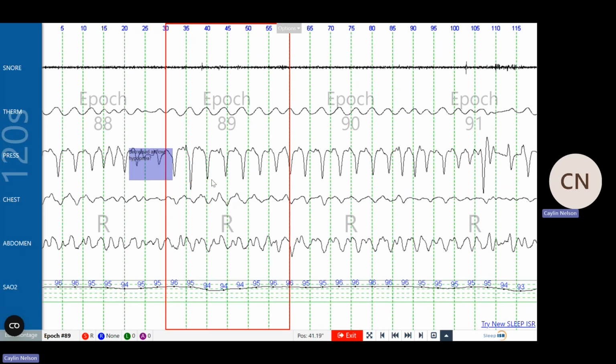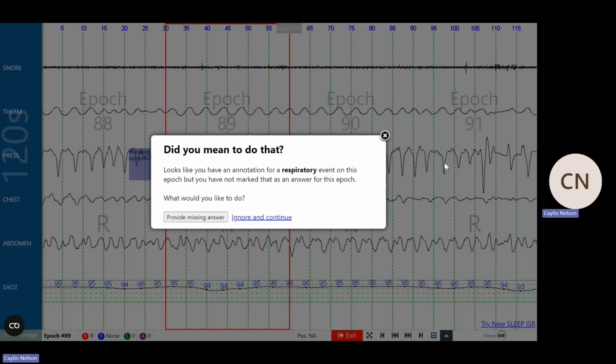So you can see those breaths that happen directly after it are pretty large, which could be a reason that patient didn't have any associated desaturation. Those breaths after the decreased airflow compensated for that. So it dropped a little bit, but after it did that, it actually went right back up. So it went from 96 to 94. But after those compensating breaths, it went up to 96.